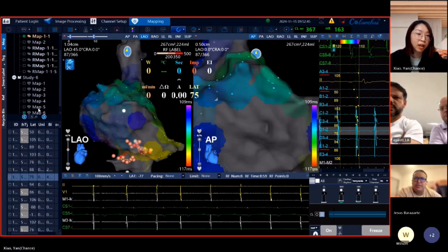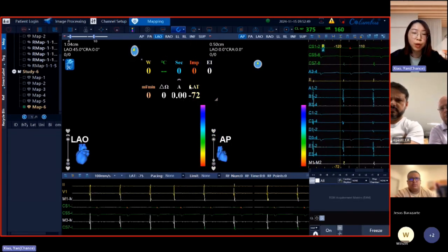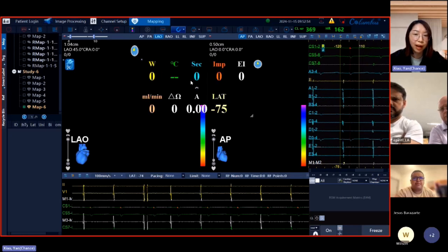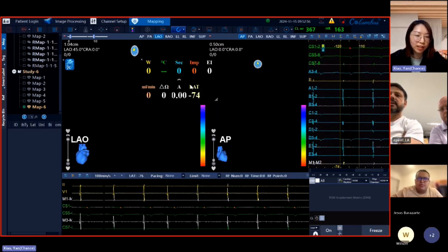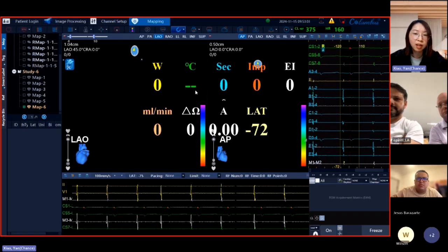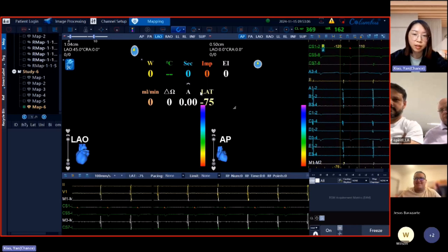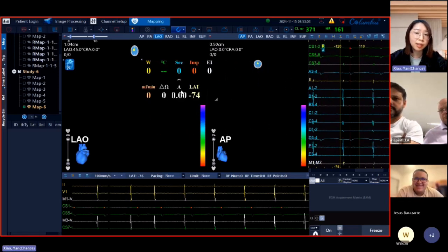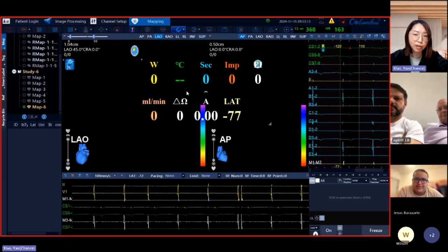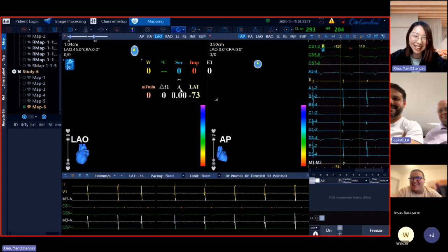Okay. And also there's a very popular update, and a lot of technicians love this. We can modify the size. We use the control key and the middle mouse button to adjust the size of the parameters. There are 6 levels: press control, and I like this. You like it. I know. You like it a lot.